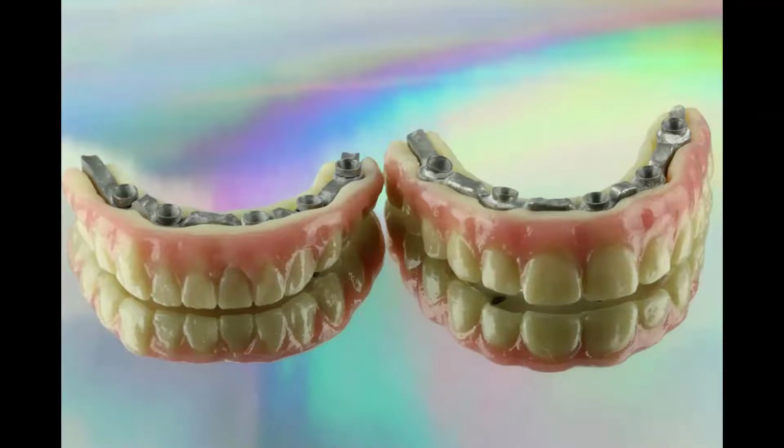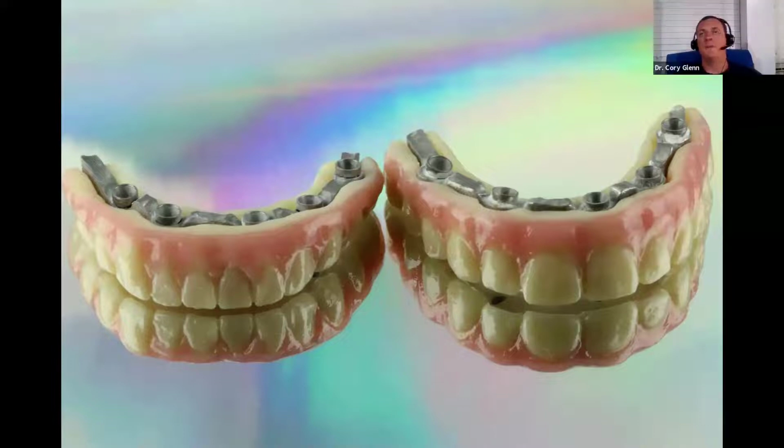Okay. How do you preview the index position of the implant when planning a tie-based crown before surgery? Well, remember, you've got your virtual implant. And so when you position a tie base on it, that shows you exactly where the tie base margin is. So that might tell you that you're placing it way too deep or way too shallow.